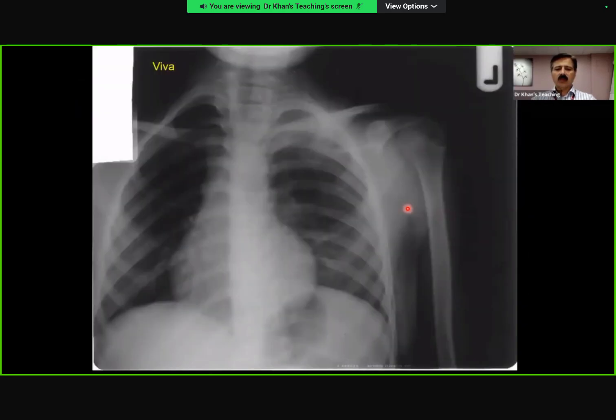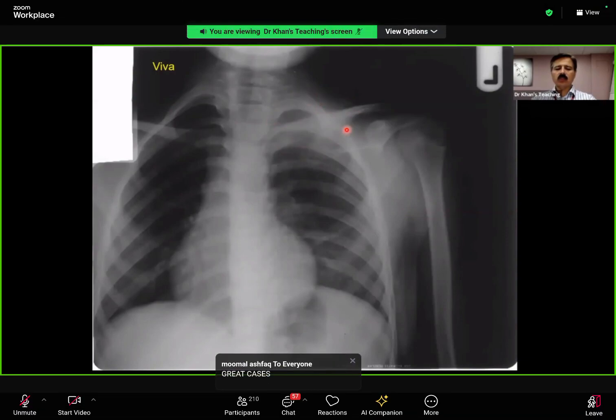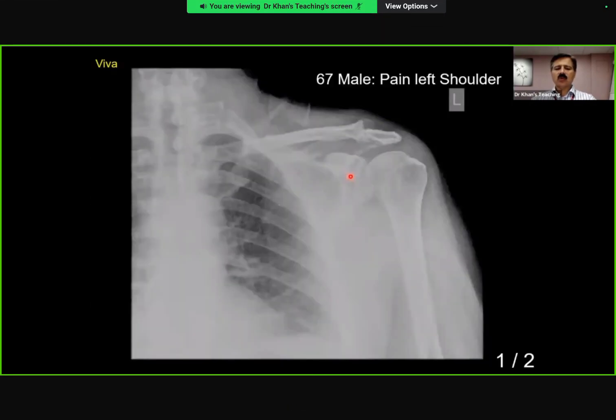This is a case of clavicle periosteal reaction. And the differential will be Ewing's versus infection. This is a case of, again, an observational film in which this tumor was actually missed by us. And it became a sort of a complaint type of case. If you see here, why I'm not giving it to you, because the resolution is not very good.